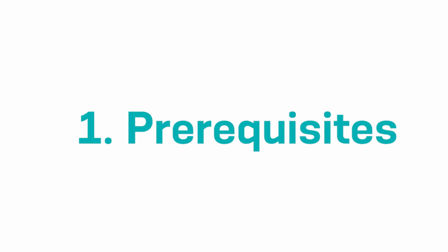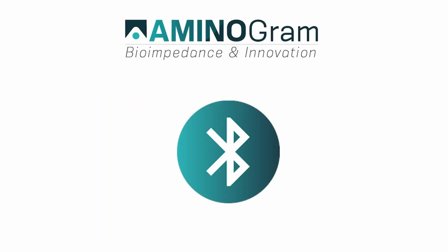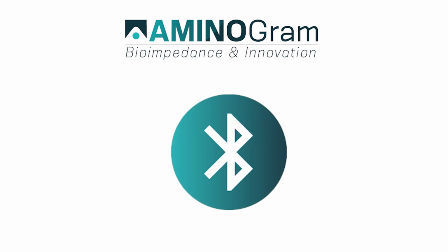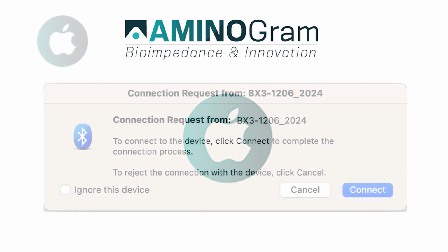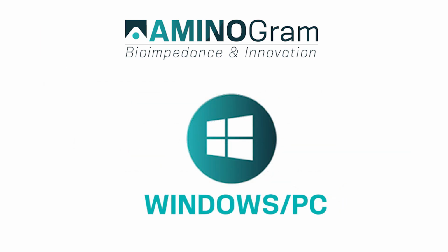Part 1. Prerequisites. This section covers the initial settings required in your browser and Bluetooth pairing. The Bluetooth pairing process is the only part that differs between Windows and Mac, so please watch only the part that pertains to your device. Let's start with Mac users. Later in the video, during the measurement synchronization, a pop-up will appear, and you will simply need to validate it. And for Windows users, here's how to proceed.